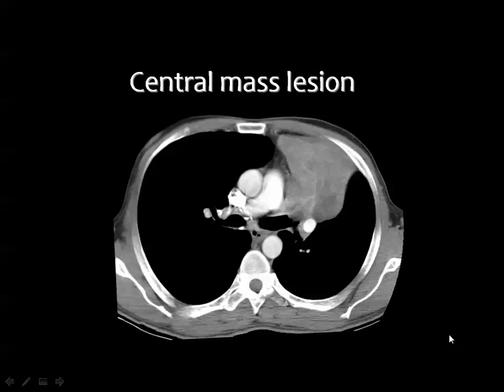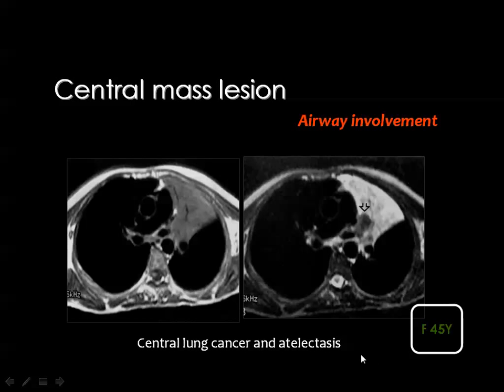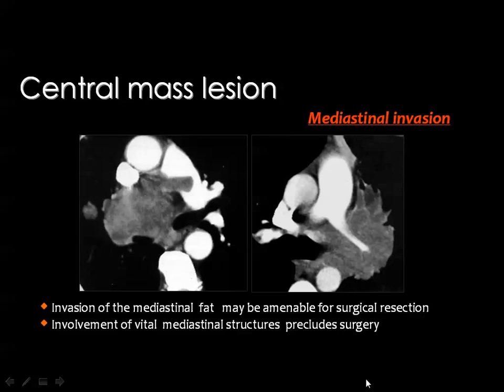And this is very important whenever we are going to irradiate this patient or whenever we are planning to take a biopsy from this lesion, and we know that there is a good part of this lesion representing consolidation, not related to the tumor. But using MRI, we may be able to separate the tumor from the consolidation based on the signal behavior. You know that consolidation contains more fluid than the tumor, so in the T2 weighted images, the consolidation will appear brighter than the tumor itself, and we know this is the site of the tumor and this is consolidation.